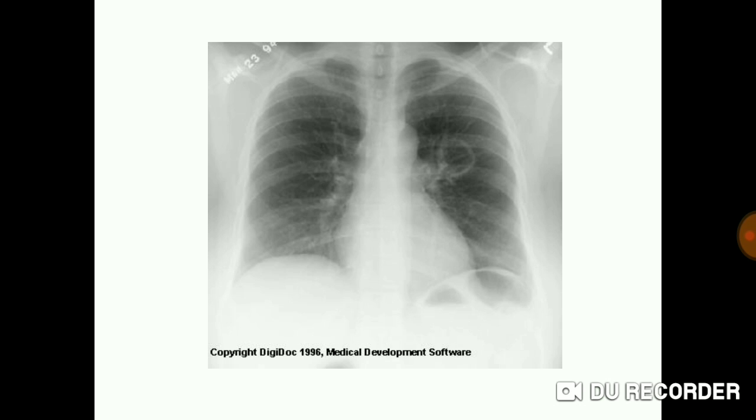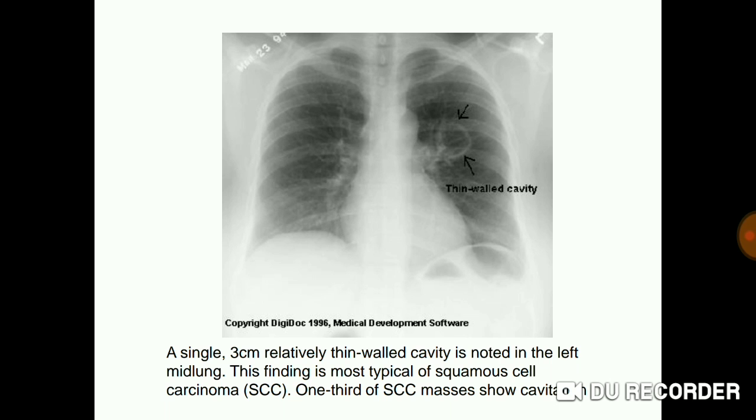What can you see in this X-ray? Here, a single 3 cm relatively thin walled cavity is noted in the left mid-lung. This finding is most typical of squamous cell carcinoma, SCC. One third of SCC masses show cavitation. Case 2.